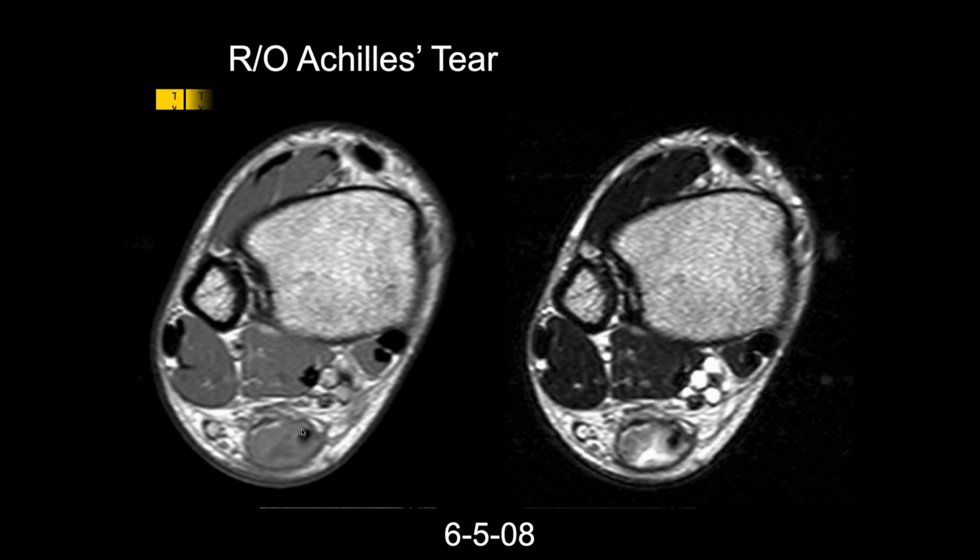I don't really see any normal tendon. What's this? I guess that might be a little bit of normal tendon versus, is that a focal deposit? Longitudinal structure that goes up and down. Okay, so I guess it is some persistent remnant of the Achilles tendon then, right?